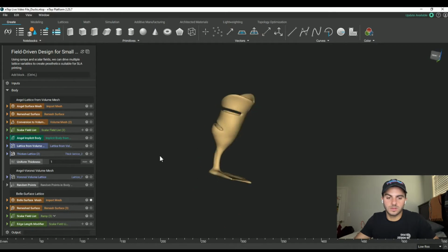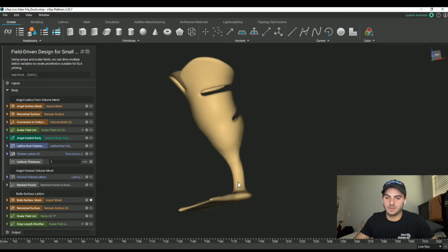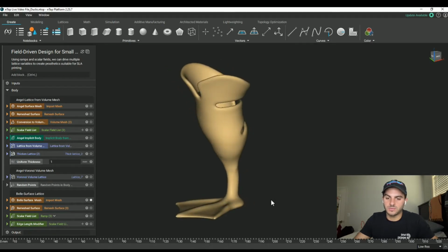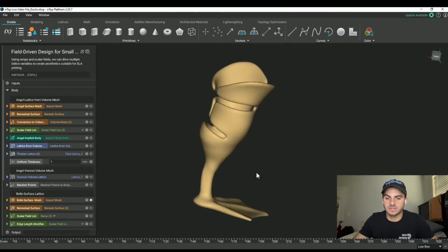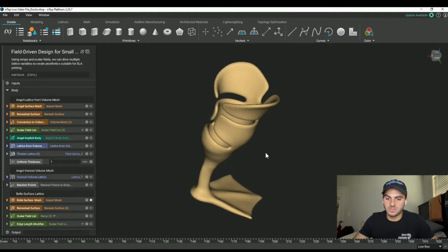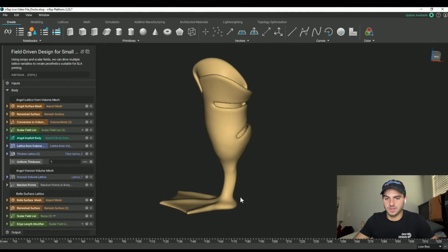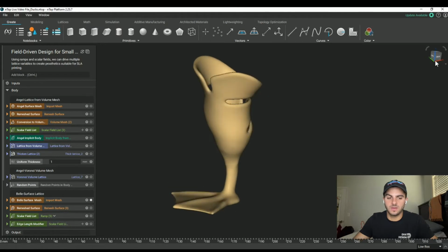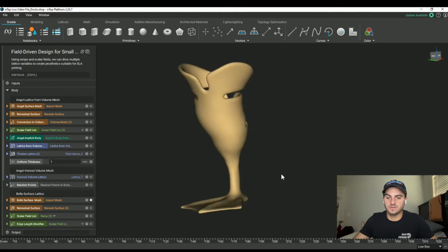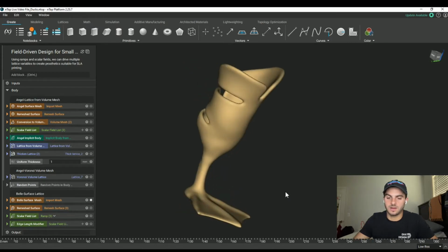So moving forward, we can look to our next patient, which is a duck named Belle, right? So again, we have an imported mesh file, and we want to optimize that for SLA printing, which means we want to decrease the surface area in between those layers when we bring it into our slicing software, right? So again, this was created using a 3D scan of Belle's limb, and we added some notches in the design, and also a scan of Belle's healthy limb to balance the overall aesthetics of the design. In my opinion, it looks awesome the way this came out.